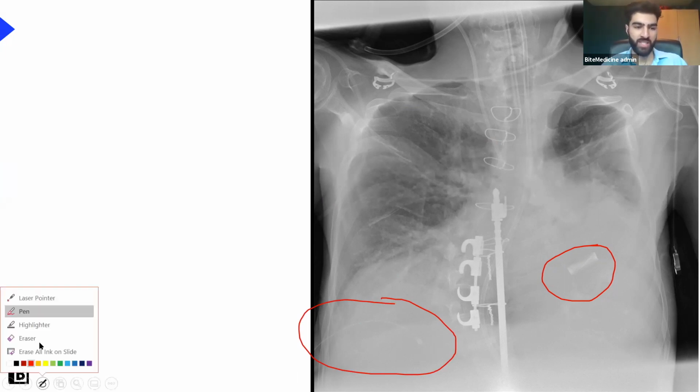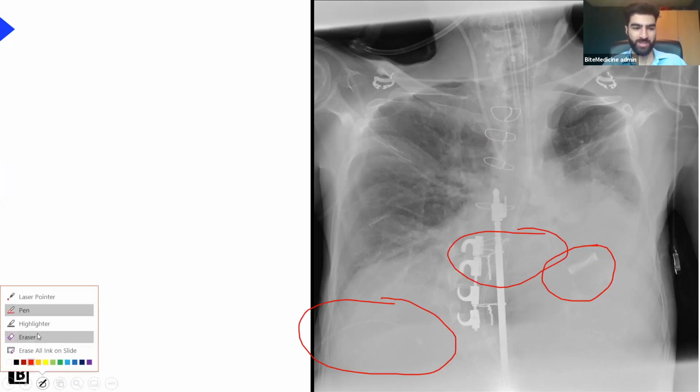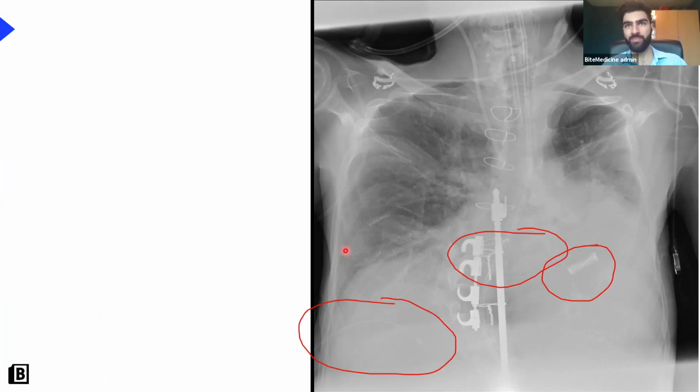So this patient's obviously seriously unwell, and we've missed the massive elephant in the room. What's this thing here, this massive piece of metal? So that's a spinal fixation device. The patient has had spinal surgery, and probably orthopedic surgeons have put a big metal rod in their spine to hold, like to try and correct the position or something like that. So it's a spinal fixation device.